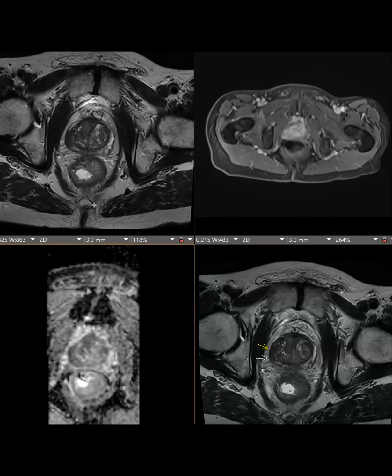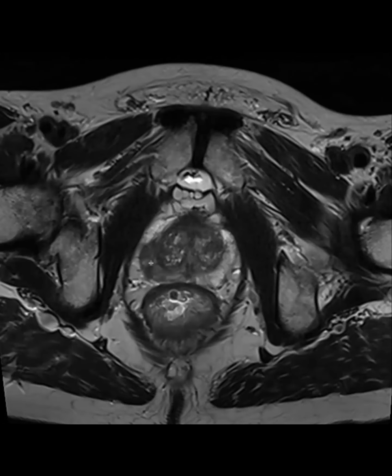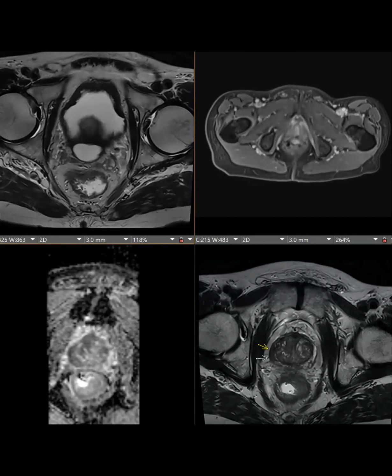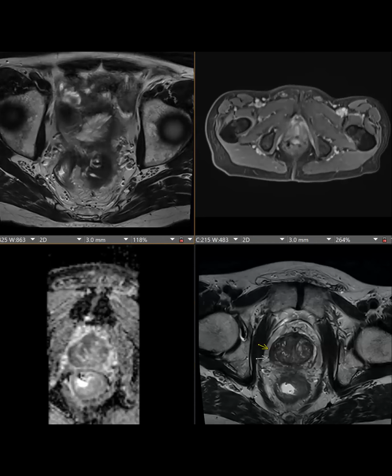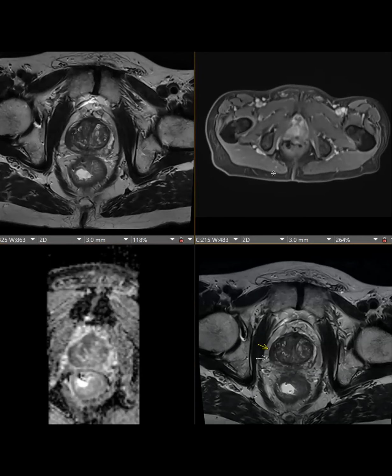Okay, I'll show one. This was a prostate MR, and there's a lesion here in the right mid-peripheral gland, and it restricts right there. It's our ADC map. And just like the other case, you just keep looking.